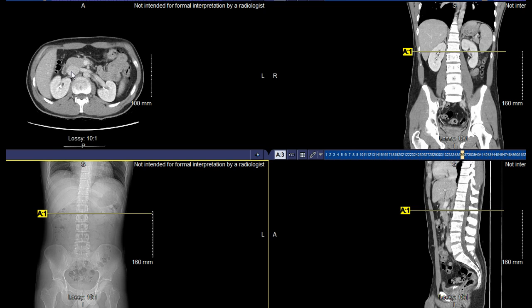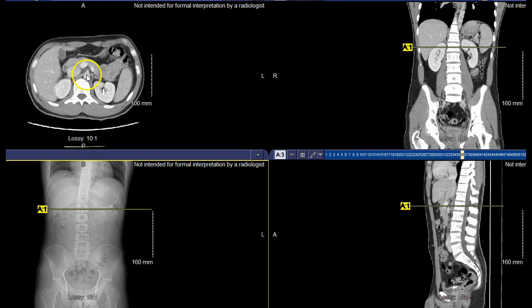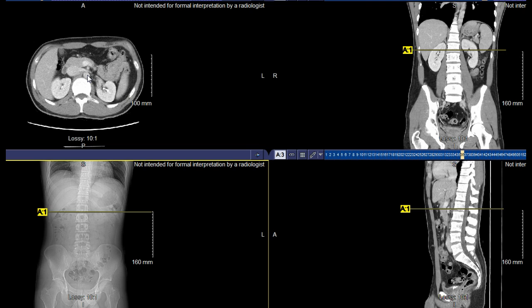Subsequently, as we're at this region now, I want you to note, all right, here is the abdominal aorta, and I want you to be able to see how that branches off to form the renal arteries as well. So you can see that connection right in there with the renal artery on the left and the renal artery on the right. So right and left are demonstrated pretty well respectively. And you can see that anterior versus posterior position. So the renal vein would be a little bit more on the anterior side than the renal artery would.